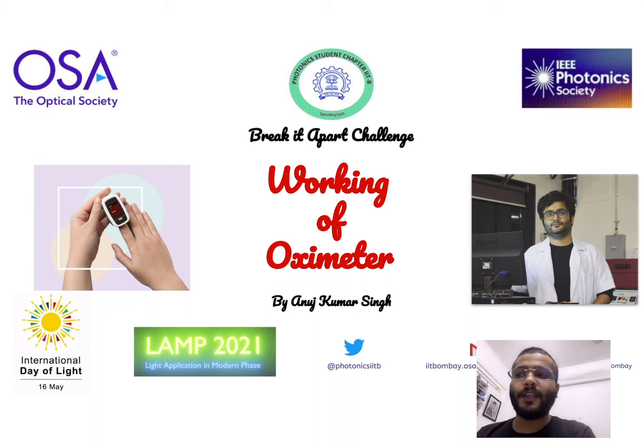We are celebrating International Day of Light on May 16th, and this time OSA IEEE IIT Bombay brings a challenge called Break It Apart Challenge. In this challenge, basically, we will use an optical device and break it and explain the physics behind that.